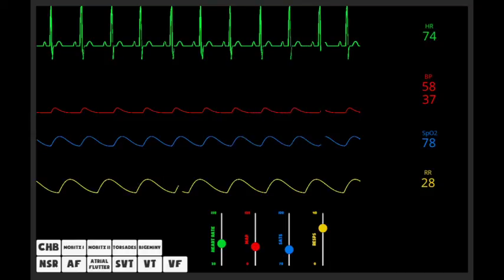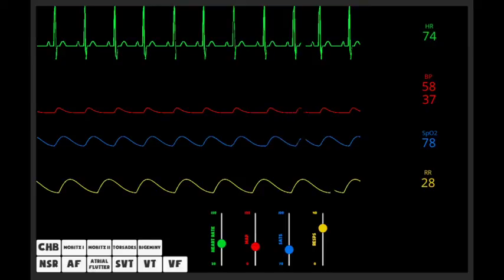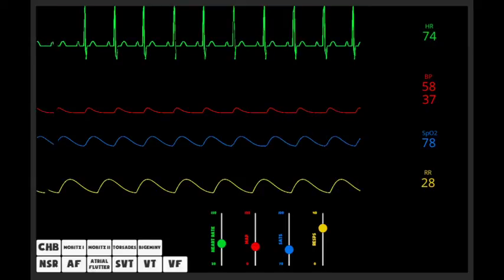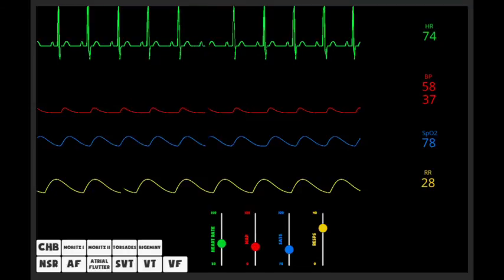And what's quite neat is that if you have a modern smartphone, and almost all modern smartphones will do this, you can switch on 3G sharing and it will create a small wireless network. And the simulator and the remote control will connect over that. So you can really do this anytime, any place.